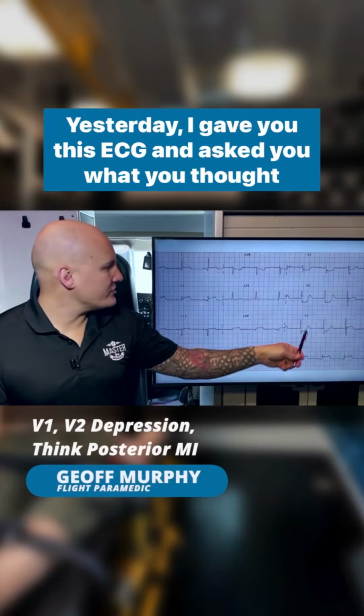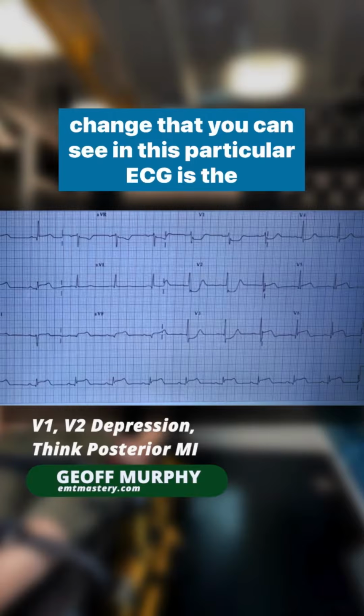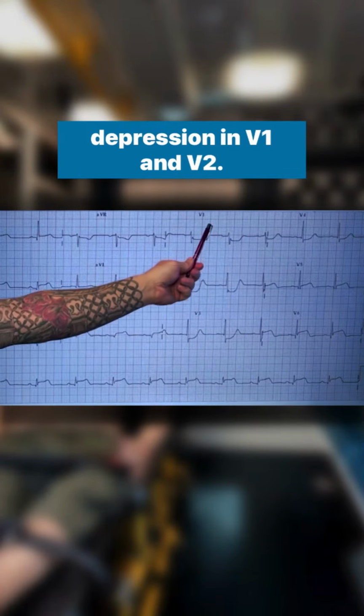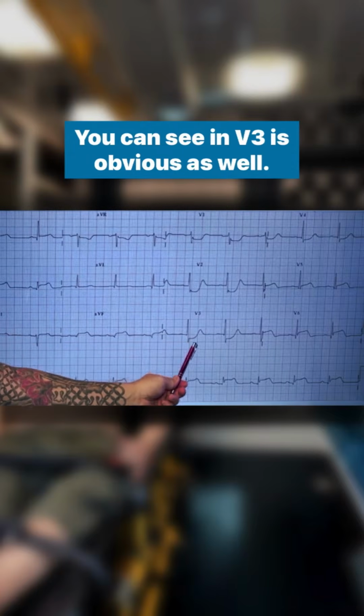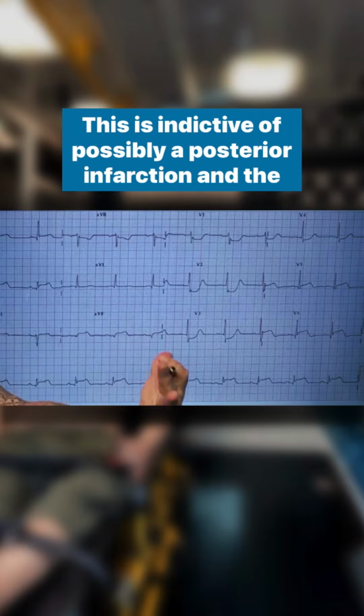Yesterday I gave you this ECG and asked you what you thought about the changes that you're seeing here. And the biggest change that you can see in this particular ECG is the depression in V1 and V2. You can see in V3 is obvious as well. This is indicative of possibly a posterior infarction.